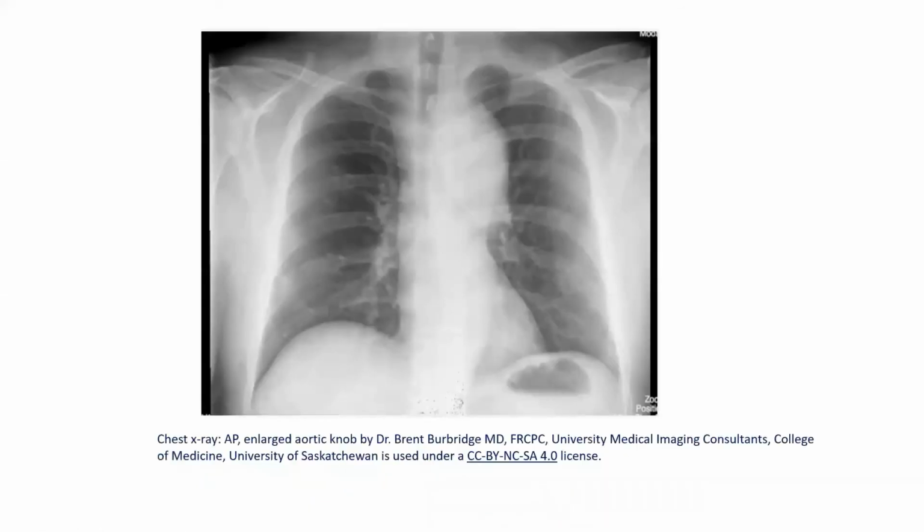Now, what is this? Wide mediastinum. Yes, very good. This is wide upper mediastinum.